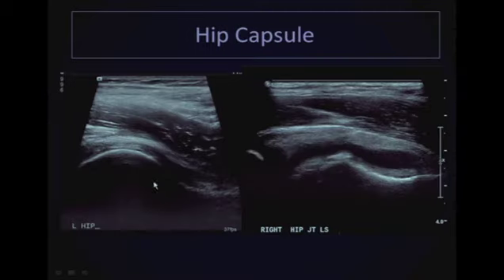Another thing to know about the hip capsule is that you don't want to confuse that for fluid. So here the hip capsule can be seen. You can see that it's this soft tissue structure that extends from the acetabulum, covers the femoral head, and comes down as low as the femoral neck. And you don't want to confuse this for a hip effusion. You want to see that you're looking at fluid versus solid. In this case, the hip capsule is actually distended with fluid. So now you can appreciate again how far down the hip capsule extends and where it belongs, and to not confuse it with fluid.